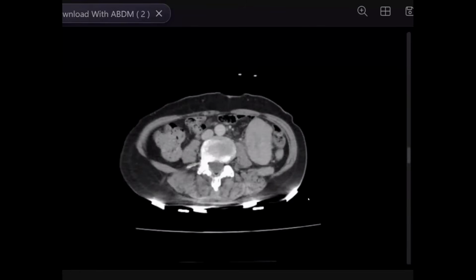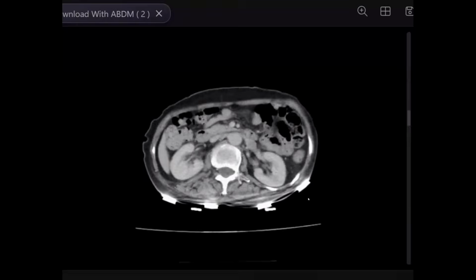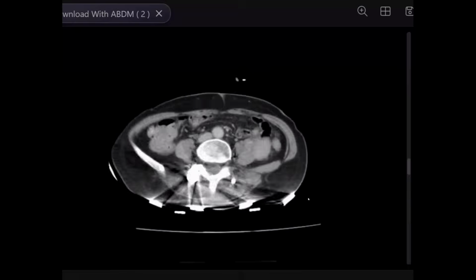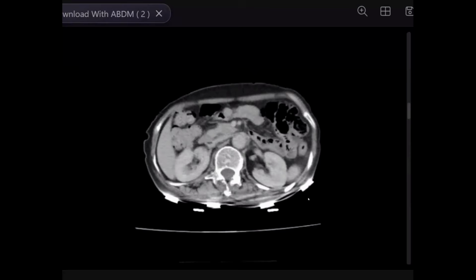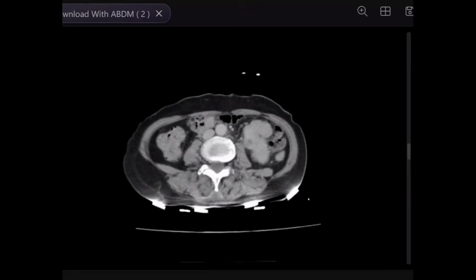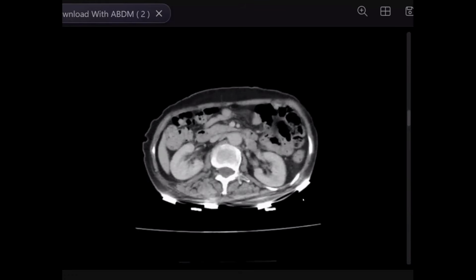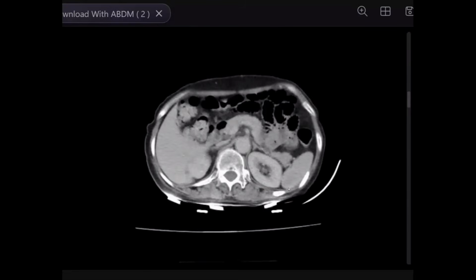I don't see the left ovarian vein. Perfect. So I'm suspecting a mass arising from the left ovarian vein, which has these solid and cystic components. This could be a malignancy, probably arising from the wall of the vein, so it's likely to be a sarcoma. Which type of sarcoma? Leiomyosarcoma, yes, perfect.